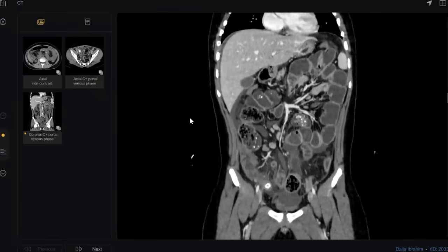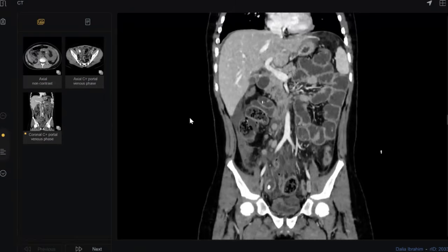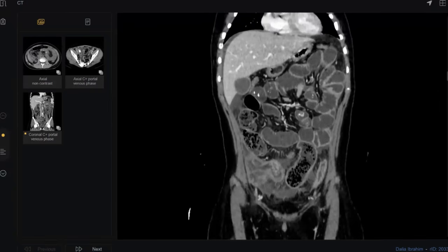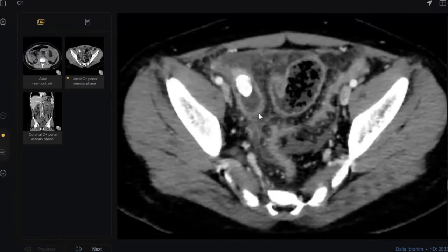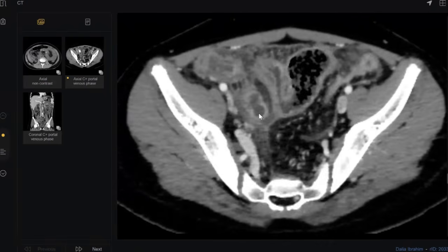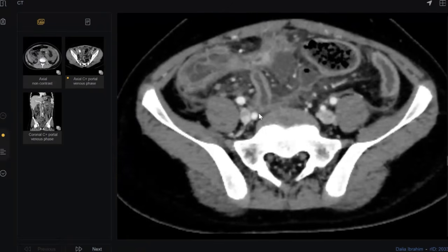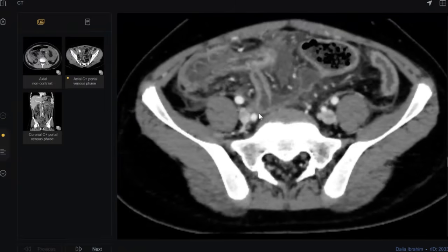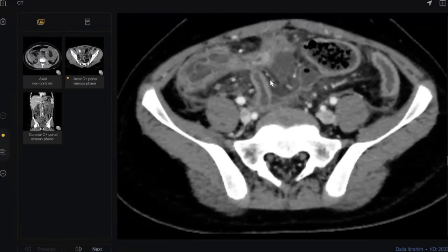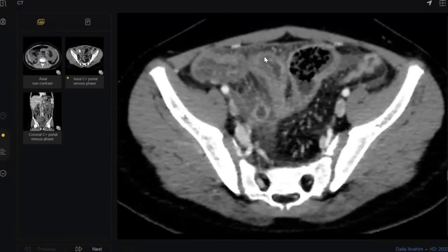Is it clear for all of you, my colleagues? Yes, sir. Okay. So take-home message. The pathology is here. Don't confuse yourself. Trust in your eyes. This is the first point. Second point, don't give unusual differential diagnoses. Why? Look here. This is very blind-ended. This one is a tubular structure connected with the rest of the small bowel. Look, this one.